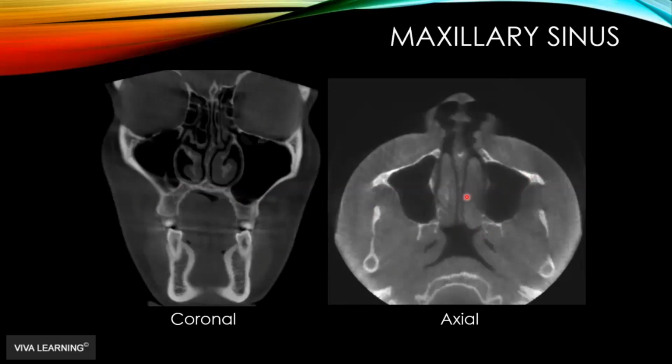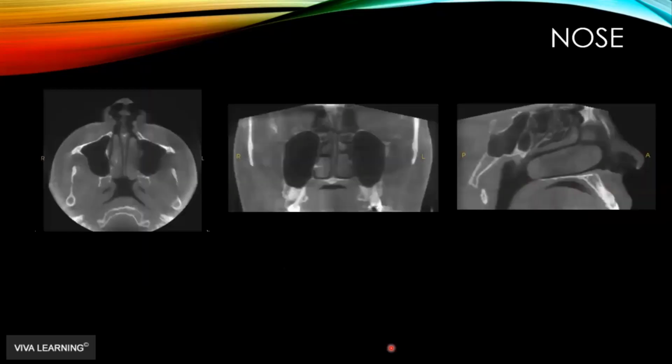So here's the maxillary sinuses. Obviously, here's the medial and lateral pterygoid plates. This is the nasopharynx here. We're about at the level where the mandible separates into the coronoid process and the condylar neck here. So this is the kind of level we're at in this axial view. What I want you to notice is how you've got this nice little S shape on the left side and reverse S on the right side. That's the kind of shape that we want to see, and you want to make sure that your margins are all nicely intact. So let's look at the nose.